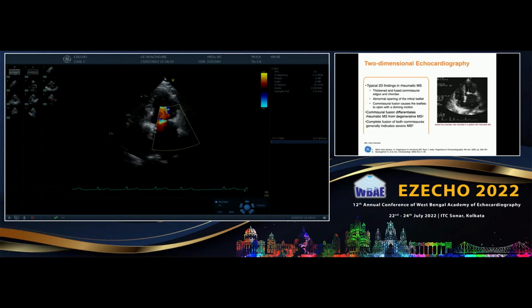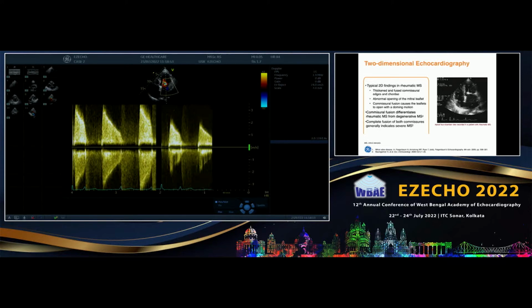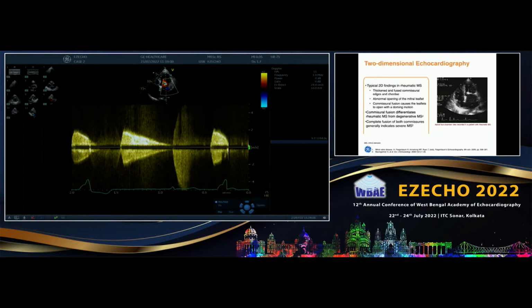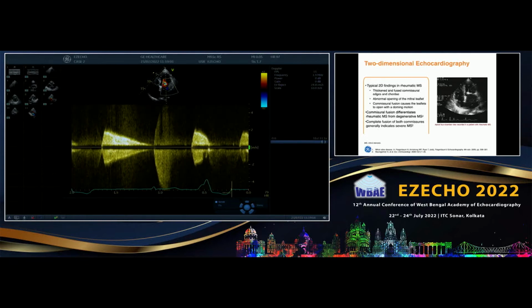And now we have got the explanation for this dilatation: it is the remodeling related to the AFib. So probably he had uncontrolled AFib episodes which had caused the tachycardiomyopathy. Though now he is 90, there may be episodes throughout the 24 hours where he may be suffering. So that has another clinical impact. See how much wealth of information echo gives you. That means now I will be more careful about controlling even his heart rate. Probably I'll bring it down more in the office, because throughout the 24 hours you have to relieve the LV. Very, very important.